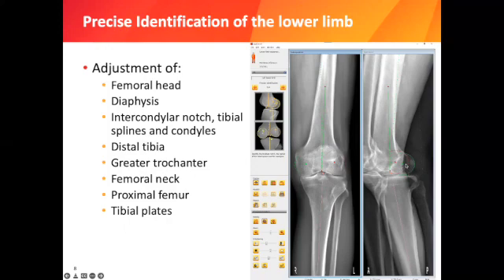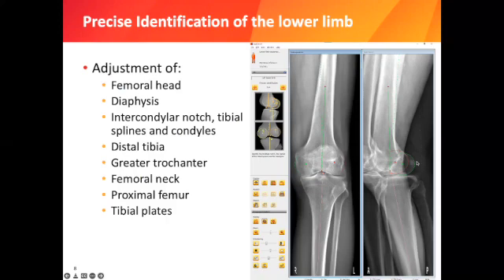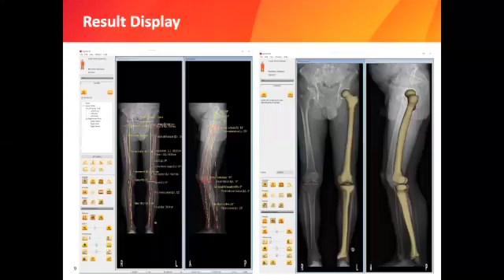But the important thing to notice here is that the software has a built-in tool that'll essentially landmark which is the left and right. And then essentially you have to go in and select that as well. So while it's a little bit difficult, if you actually mess these up, you will get a prompt that tells you that the condyles have been improperly reversed. So that's a good check there.